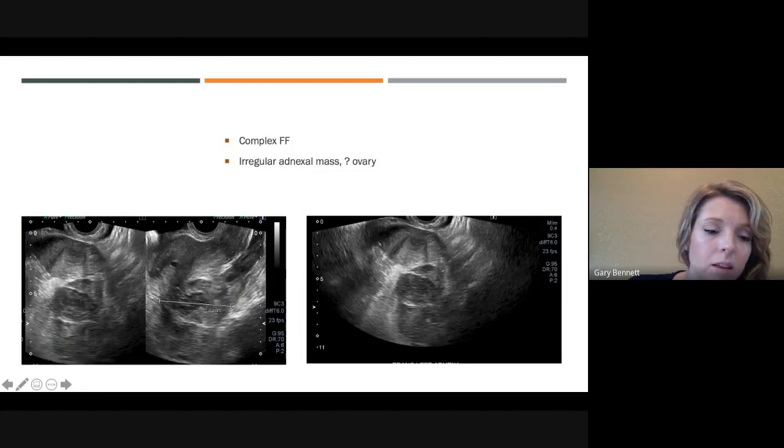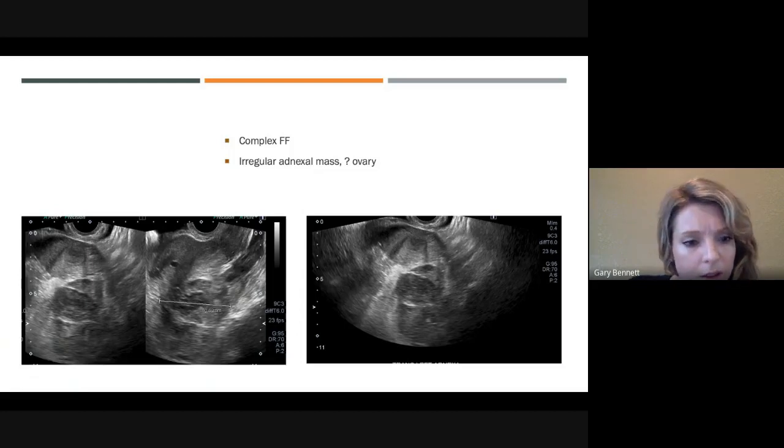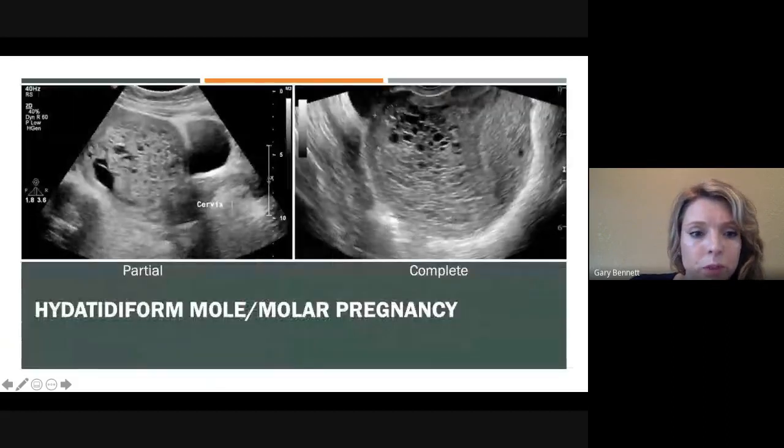But this is likely the remnants of a ruptured ectopic. And this patient's pain was just growing and growing. All this blood in here, you can see coming down right back here in the posterior cul-de-sac. So there's a lot going on here, and it's not looking very normal. So this patient did go to surgery. She got cleaned up and they read it out as an ectopic pregnancy. Even though it doesn't look clean, it doesn't hit all the markers, there was certainly no ring of fire on this picture. But she still had an ectopic and she probably wouldn't have made it a whole lot longer.